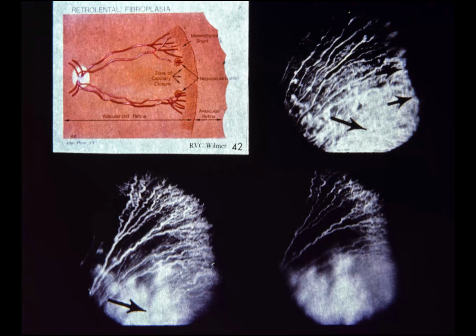Slide 42. Fluorescein angiography and proliferative retrolental fibroplasia. Flynn and co-workers in Miami first introduced fluorescein fundus photography as a method of evaluating and following infants with RLF. Upper left, artist diagram, modified from Flynn, shows findings in secondary or proliferative RLF following removal to room air.